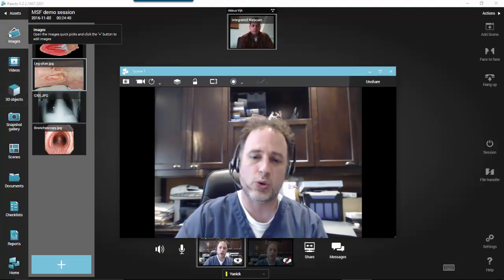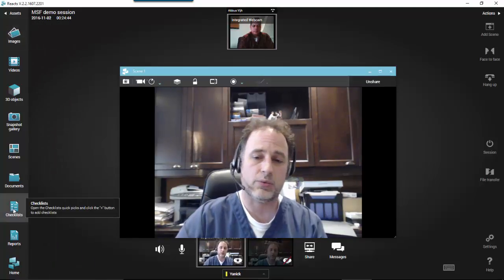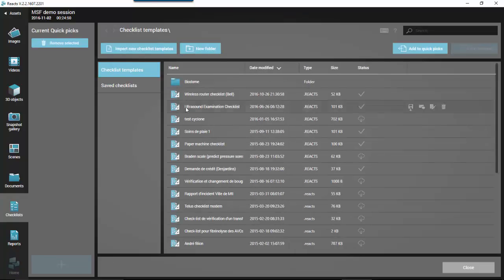Another thing I want to show you is about the checklist and reports. So if I go here in checklists, I'm going to go in my library. So let's say I'm going to go into a checklist template, and I created an ultrasound examination checklist.